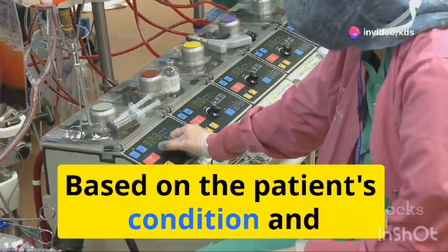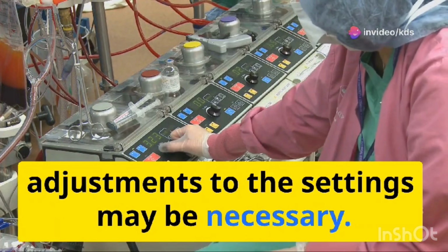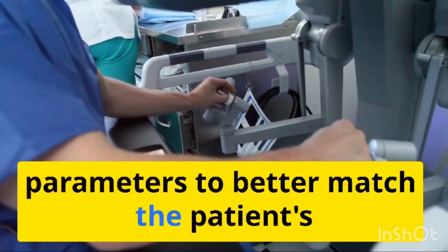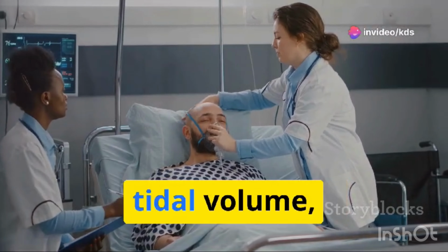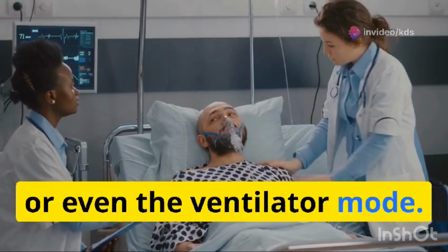Based on the patient's condition and response to the ventilator, adjustments to the settings may be necessary. This could involve fine-tuning various parameters to better match the patient's needs and improve their comfort and safety. This could involve changing the respiratory rate, tidal volume, oxygen concentration, or even the ventilator mode.